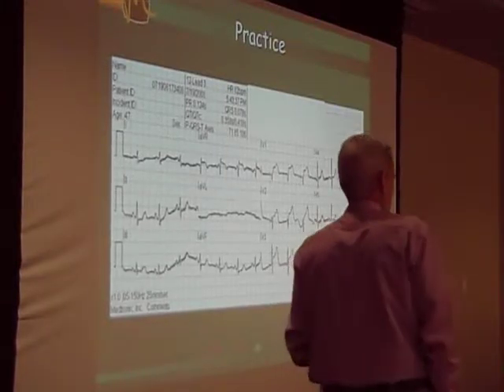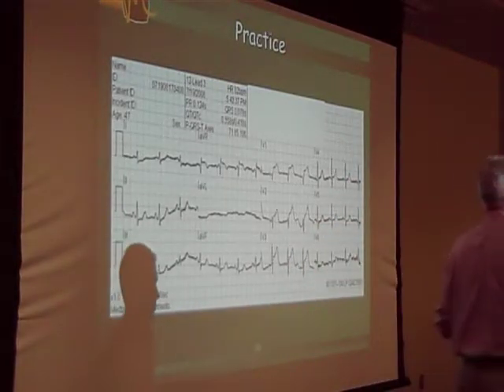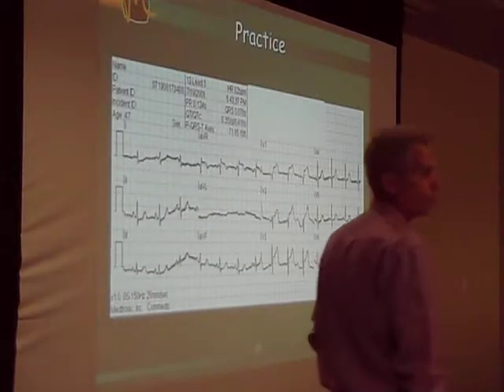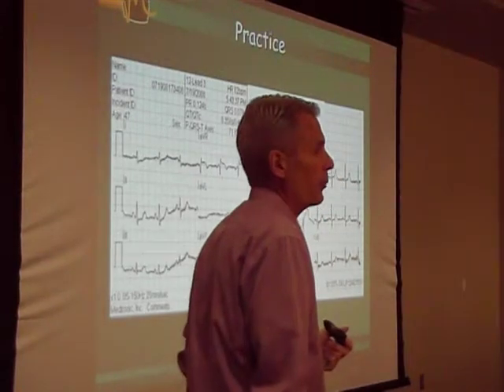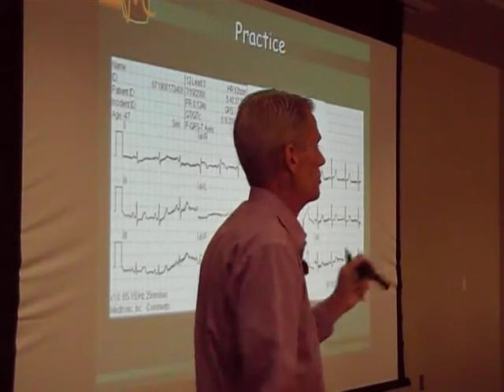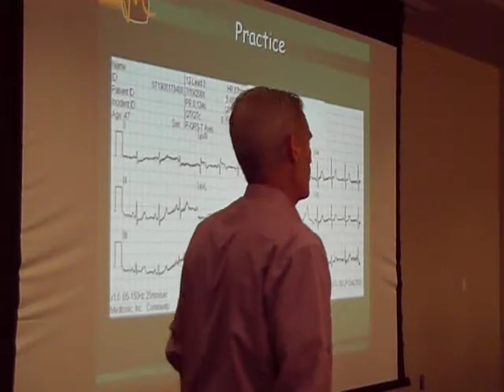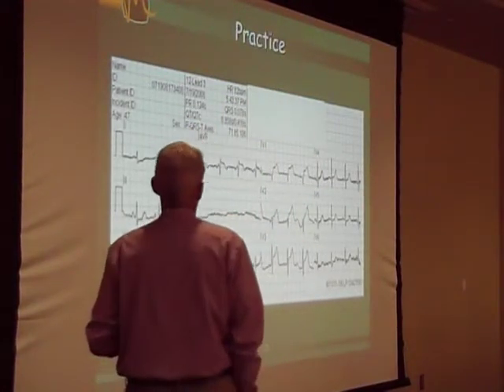Are my patches on? Are my patches good? Or did I get them out of a pouch that had been sitting there for 3 years and the gel was dried out? Did I prep the skin appropriately? And in the next module, we're going to talk about that. But it is what it is. We're going to work with this one. What do you see?